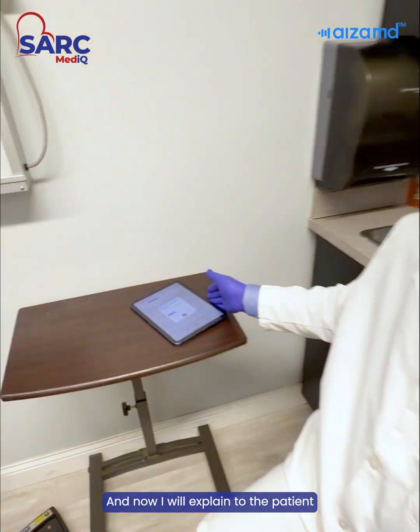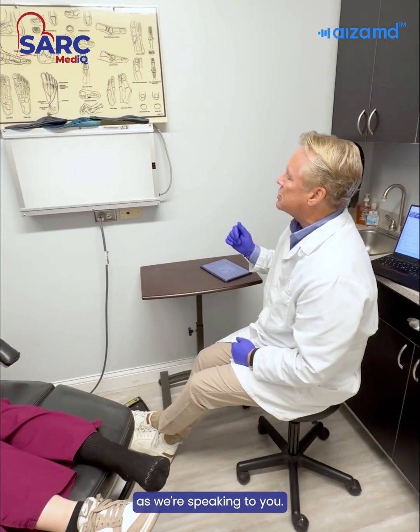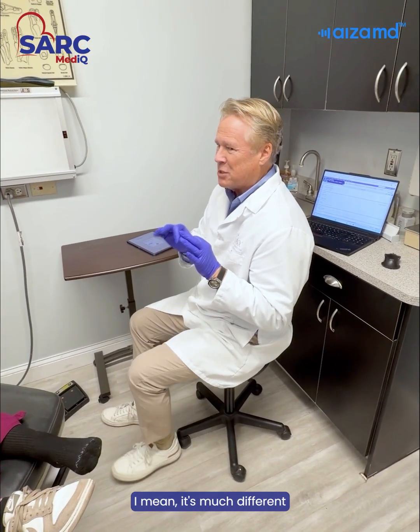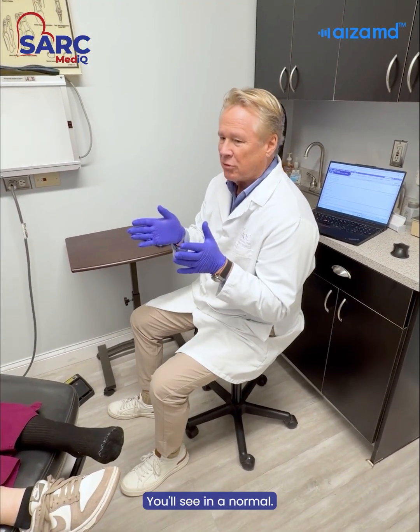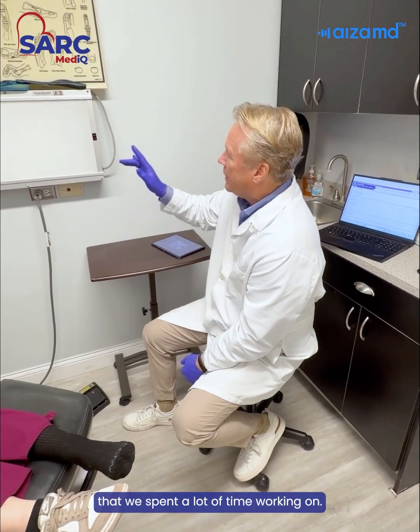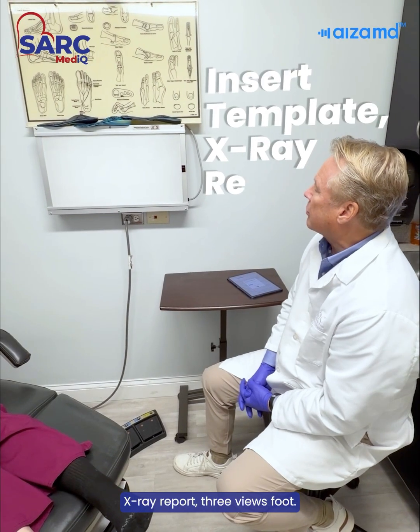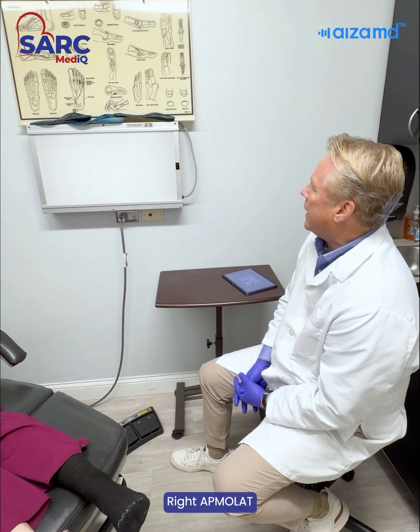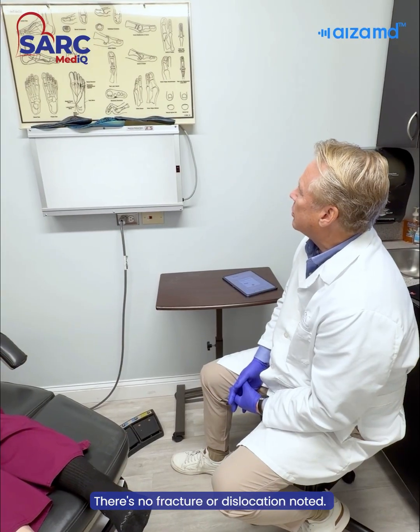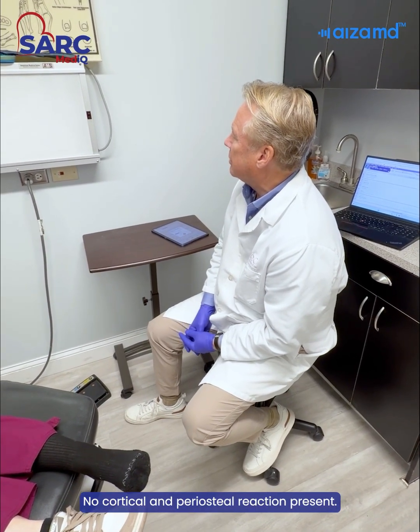Now I will explain to the patient, we've taken an x-ray and I'm going to dictate the report as we're speaking to you. It makes a full x-ray report. It's really cool. It's much different than the x-ray report findings you'll see in a normal one. This is a full x-ray report that we spent a lot of time working on. So basically, I say insert template, x-ray report, 3 views, foot right, AP, MO, lat, reveals inferior calcaneal spur. There's no fracture or dislocation noted. No soft tissue mass is evident. No cortical periosteal reaction present, period.